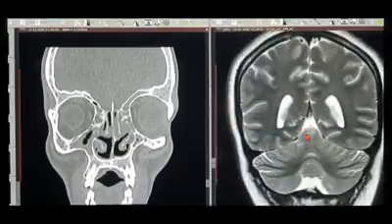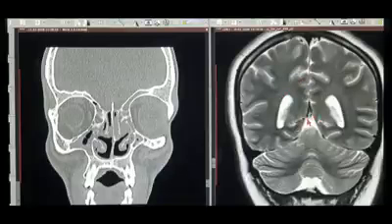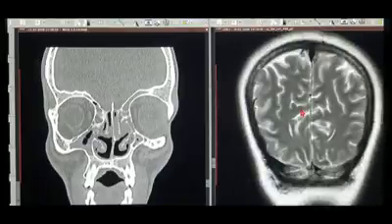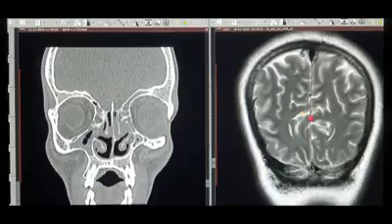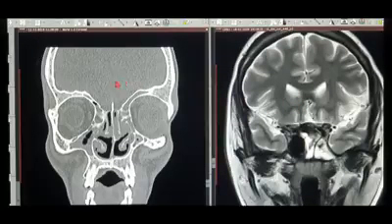This is how you can identify the brain on a given scan. If you see something like this, it is always a CT scan, and if you see something like this, it is always an MRI with a lot of alternate white and gray structures. So always remember this. This is how the brain looks on the MRI and the CT scan. So that's the first point.